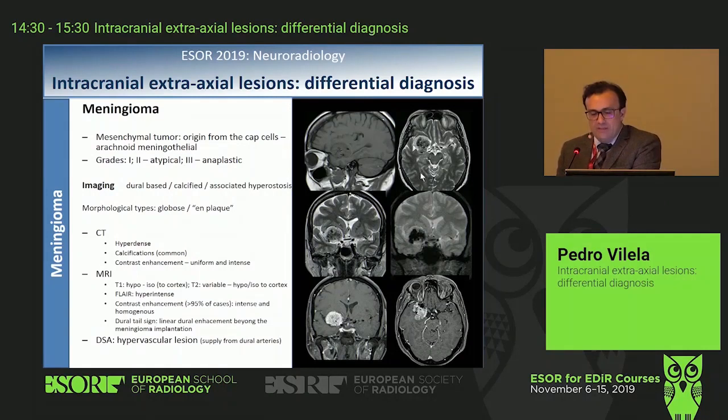So they will exhibit calcifications frequently, as you see, some low signal intensities inside the lesion, and you see it better if you do your T2 star or if you use the CT. They have a strong contrast enhancement, and it's a solid one. Generally, it's a solid lesion.